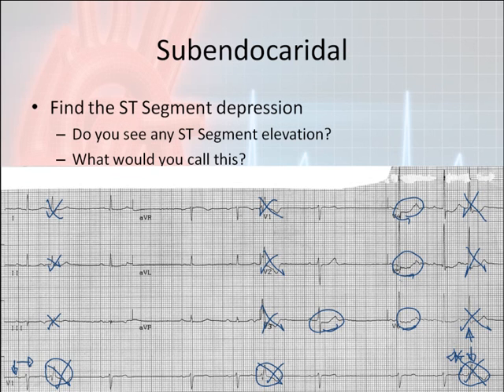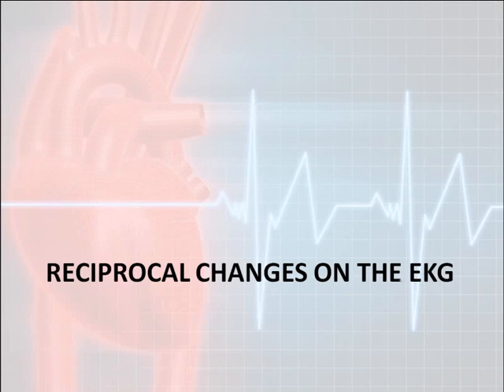What artery would be affected would be the next question. Possibly the LAD. This might be the very early stages of an LAD occlusion. Reciprocal changes on the EKG.